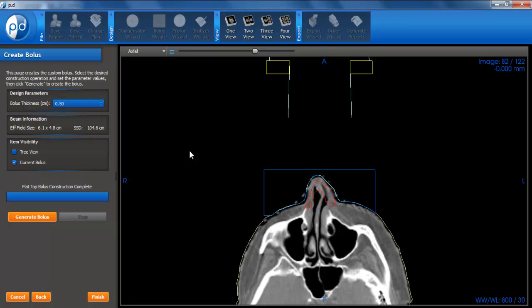So you will be verifying the plans and checking for the acceptability of the resulting dose fields back in your treatment planning system. So once you've tried this a couple times, you'll see what makes a good height for the bolus, and you'll come up with the rules that make acceptable choices for your clinical needs. Okay? Once we've got the bolus constructed, that's pretty much it. We're done. We can go ahead and click Finish.